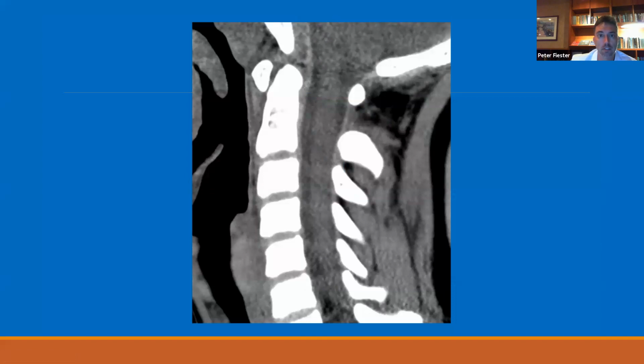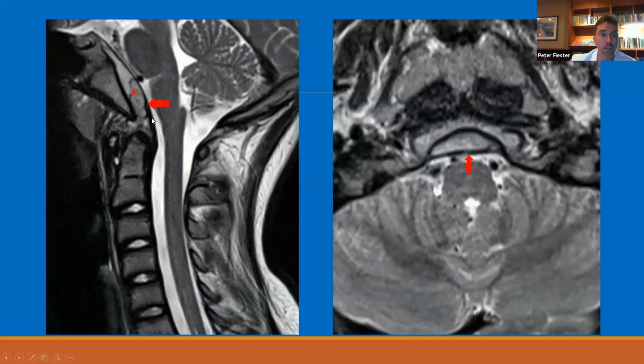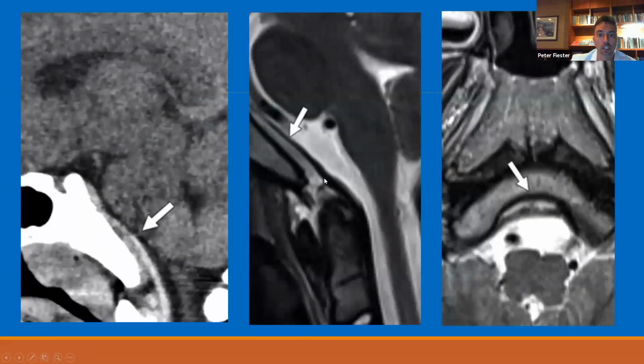Just anatomically, the tectorial membrane distinguishes those two compartments. So it's actually a stripping injury of the TM, and it's associated with other ligament injuries, like in this patient. So it really is a craniocervical junction ligament tear that presents as this hematoma behind the clivus. It's just based on the anatomy of the tectorial membrane.